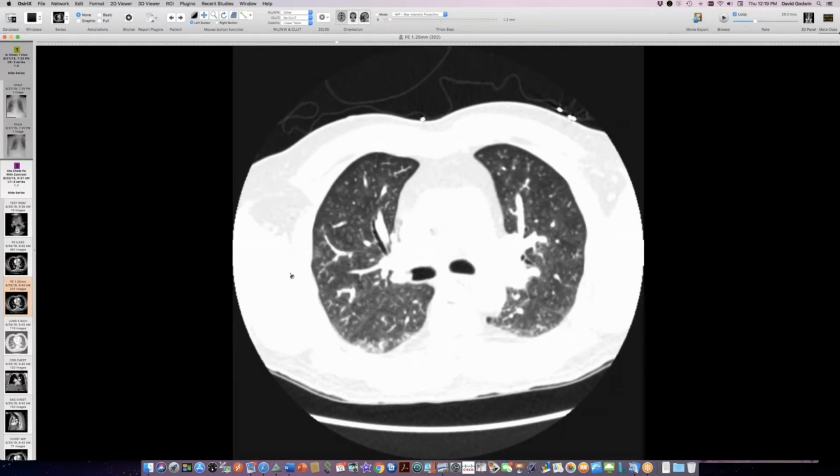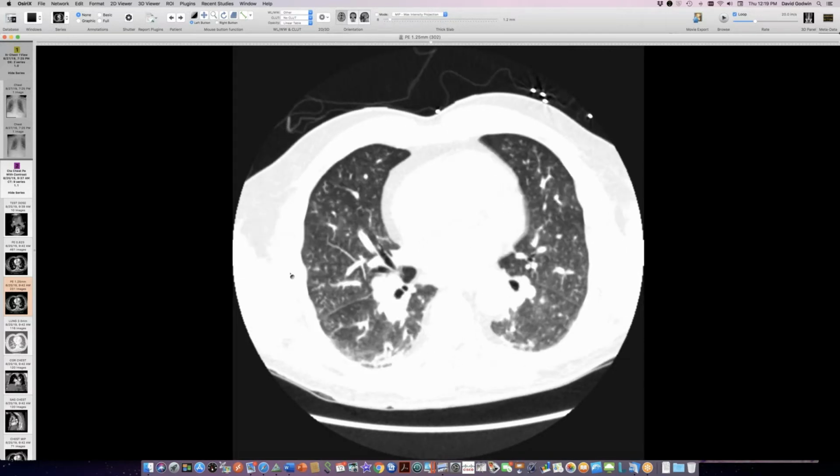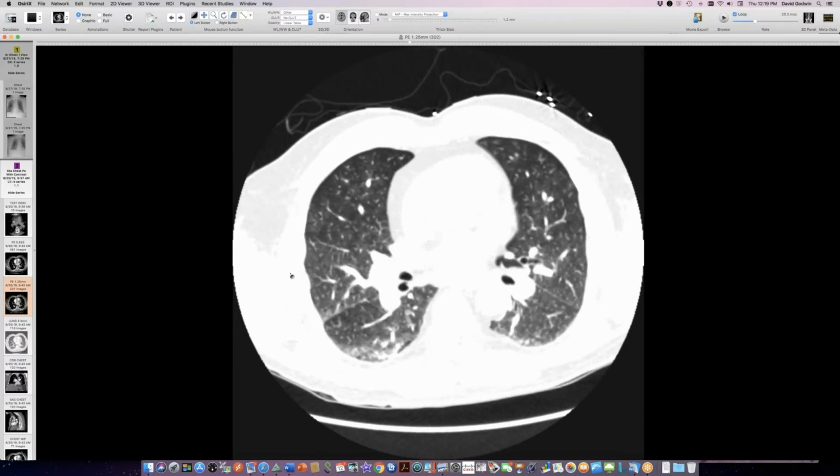Good, yeah. I've never seen a case where we almost see, well, of course, these central lobular lesions. But I think if we look behind them, maybe we can perceive a mosaic attenuation appearance. But I, of course, agree, it's really subtle. And it's a lobular level, so it's the same sort of airways pattern, you know, of small bronchiolar lesions that cause a lobular air trapping or mosaicism. This is lobular, but it's on the basis of a vascular disease. So yes, that's a good observation.